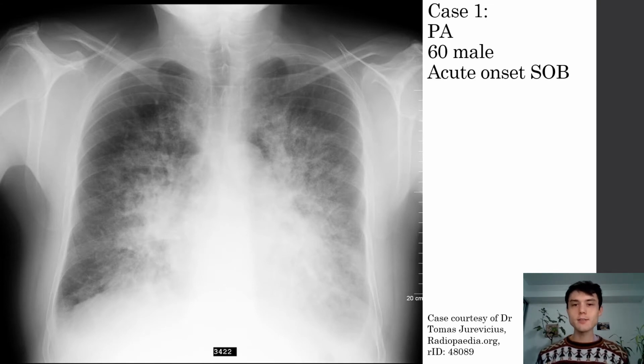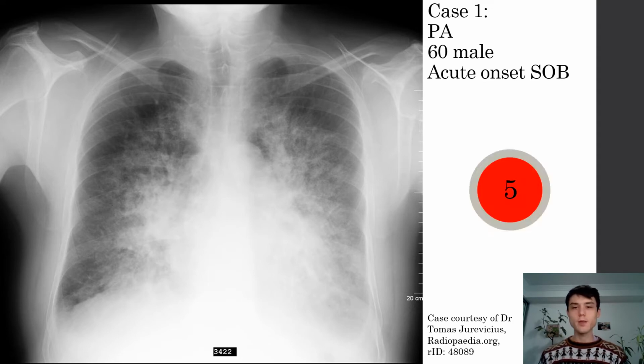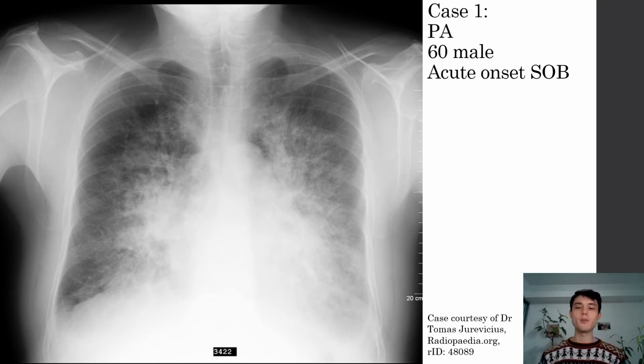This is the first case, a PA x-ray of a 60-year-old male who presents with acute onset shortness of breath. And before each x-ray, I'll play this timer, and please pause if you would like to interpret the x-ray before I jump in and start interpreting it.